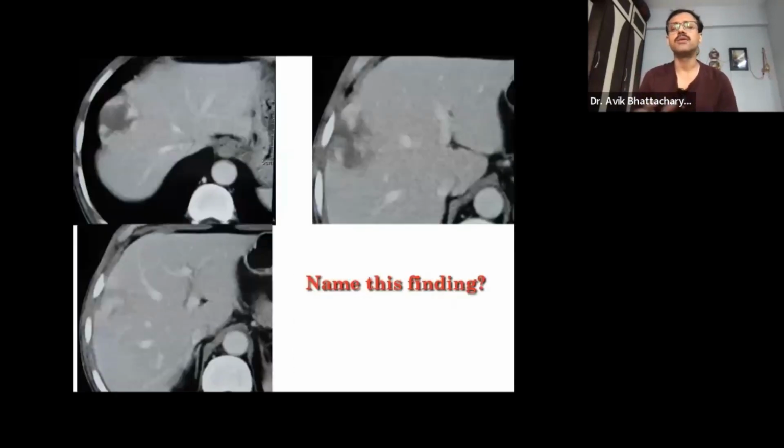So those are a gamut of different types of liver lesions, which are all mostly benign. To characterize them, we need either ultrasonography, CT scan, or MRI. Now I'll be coming slowly to the actual LI-RADS classification. Although the LI-RADS classifications are applicable to patients with liver cirrhosis or chronic hepatitis B infection, and to characterize the different stages of evolution of hepatocellular carcinoma or non-HCC malignant lesions in the liver.